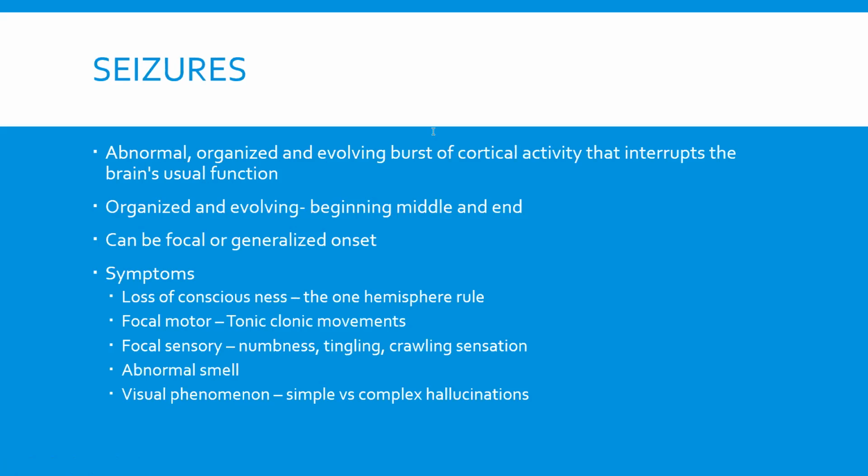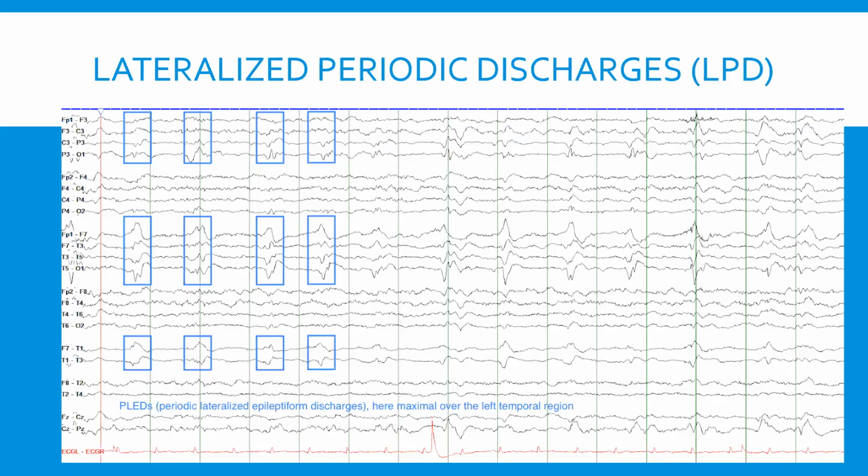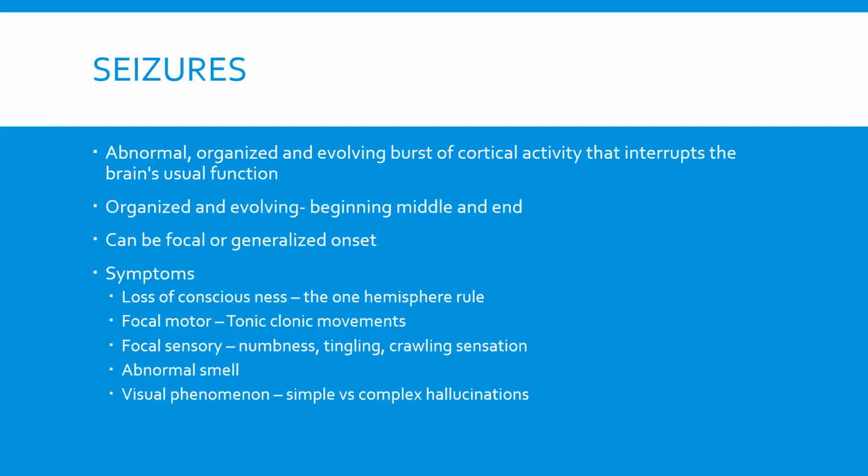Okay, so Vikram was asking, are these raw EEGs? These are processed. Going back to the previous slides, these are all processed EEG, meaning they go through a certain filter, right? Because there's a lot of noise. We filter out the noise, the very, very high frequency gamma stuff, which is not from the brain. So these are all filtered EEGs.